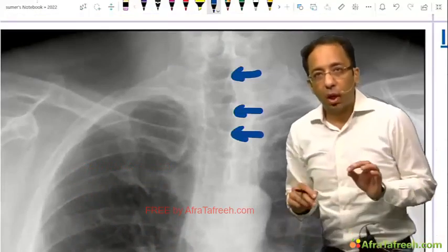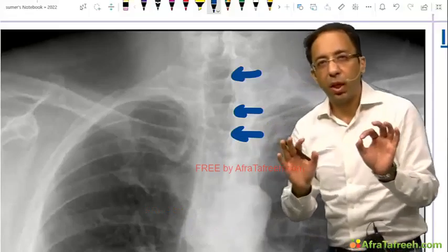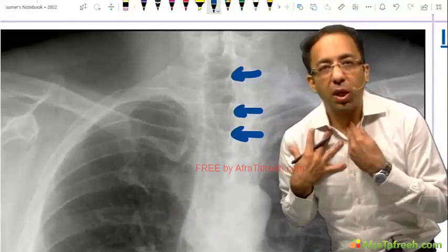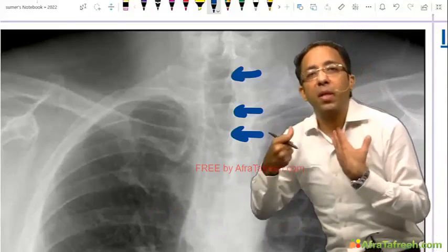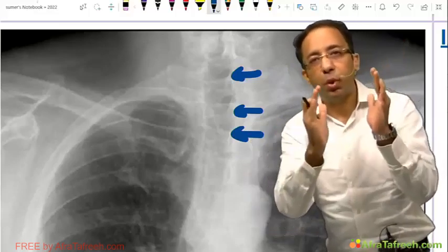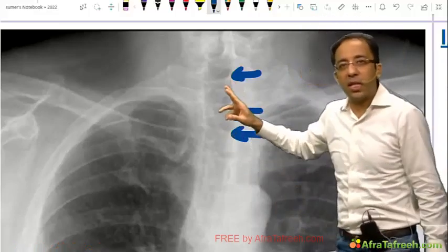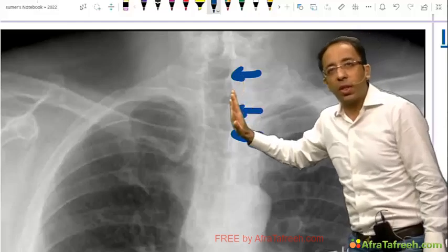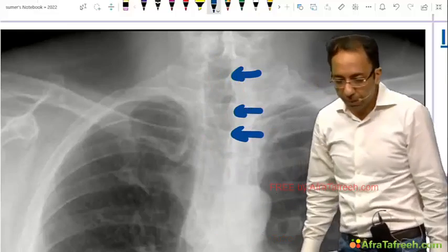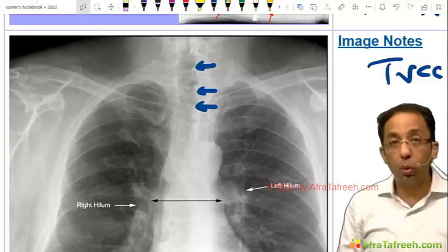Okay. Now I want all of you to listen to me. I will explain multiple times in the class, but listen to me right now. If there is a disease, I always look at the trachea and see if it is being pulled by the disease, if it is being pushed by the disease. So the position of trachea is very important. Most of the time trachea is central, and physiologically it is slightly towards the right also. So this is the normal position of trachea. Okay, are you clear? Able to understand?